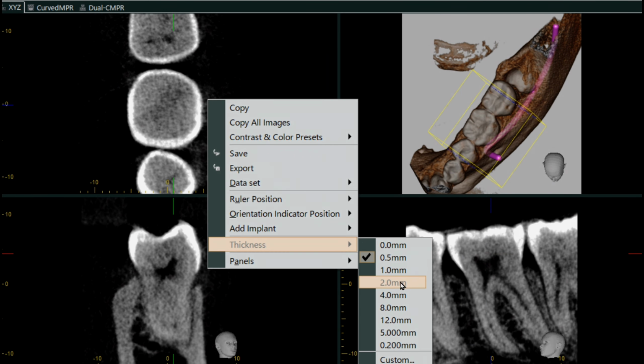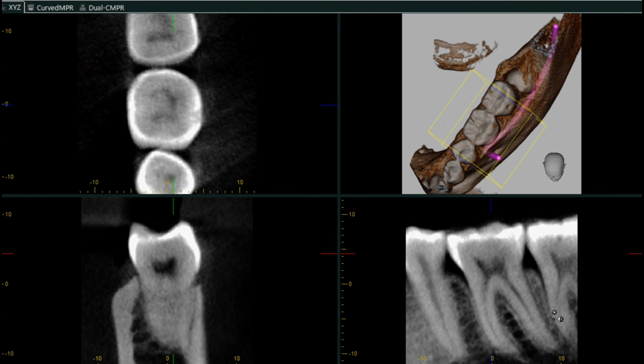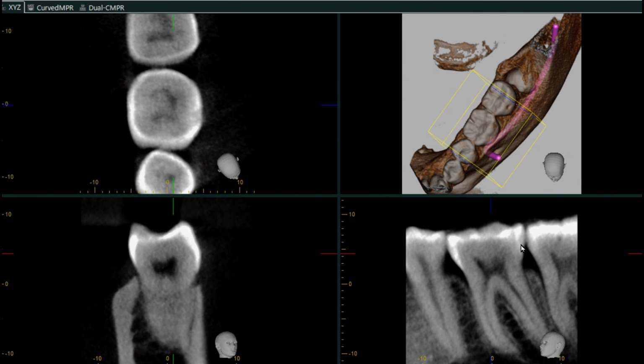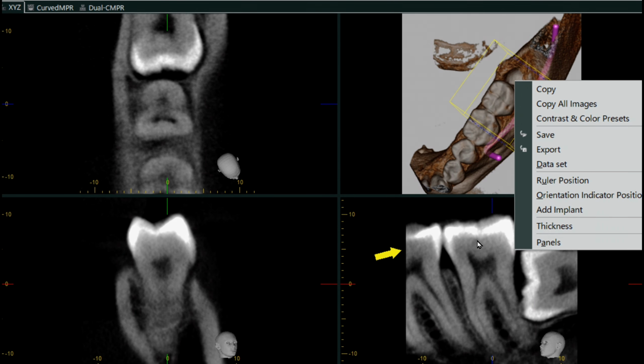Such lines are not usually visible in an RVG scan or an OPG, so a CBCT is always advisable for such cases. So this was one of the things. And now coming to the tooth of concern, 47. So this was tooth 47.